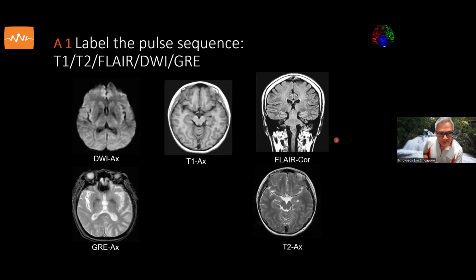These are the answers. And we recognize, starting with a T1 weighted MR image. We use this primarily to assess the anatomy of the brain. And for those who are familiar with the appearance on CT, it looks fairly similar to the CT, with the CSF being hypo-intense. Of course, there are slight differences with the CT because the bones are not high in signal.